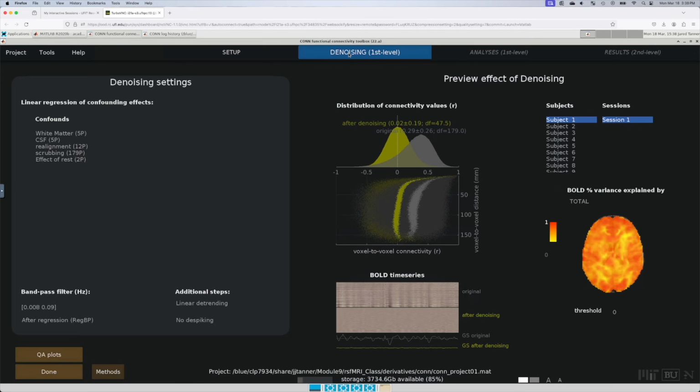And the interplay between the protons, these molecules, all of this happening in the brain and sending off this little signal that the RF receiver is picking up, is just a very noisy process. There's a lot of noise, and there's also noise from the blood flow itself, heartbeat, breathing, all sorts of things that are in there. So looking at the denoising, how do we know if the data are pre-processed decently?